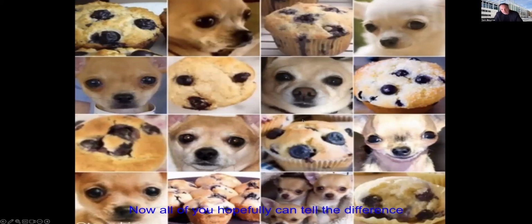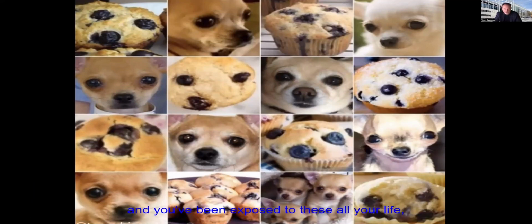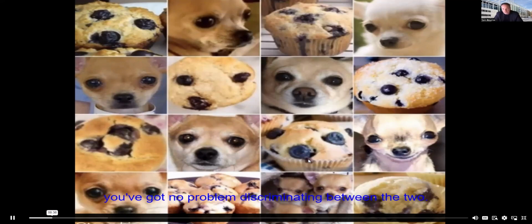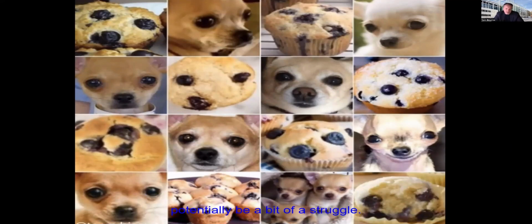Now, all of you hopefully can tell the difference between the two, but actually, if you look, they've got very similar features. But because you're human beings and you know what dogs look like, and you've been exposed to these all your life, you've got no problem discriminating between the two. But if you've got artificial intelligence to try and do this, then it might potentially be a bit of a struggle. So if you don't take care, you could end up eating someone's dog. You don't, because you're so good at this type of image analysis. And that's basically what we do when we look at ultrasound scans as well.